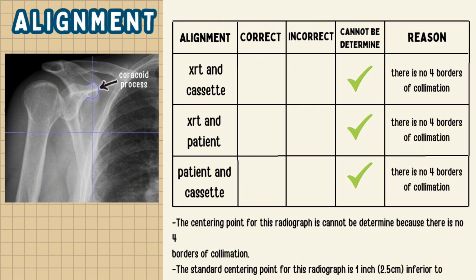However, the standard centering point for this projection should be 1 inch inferior to the coracoid process as shown in the image.